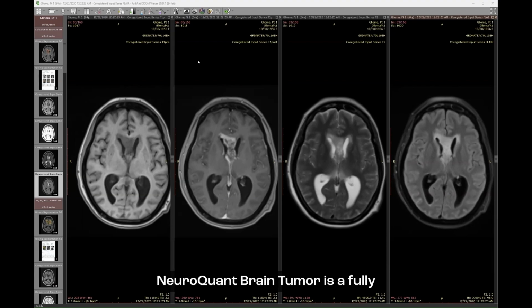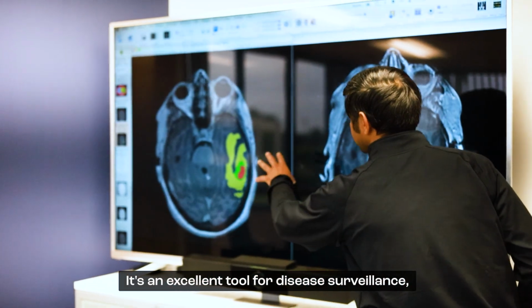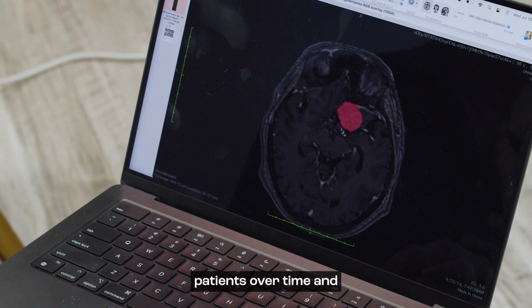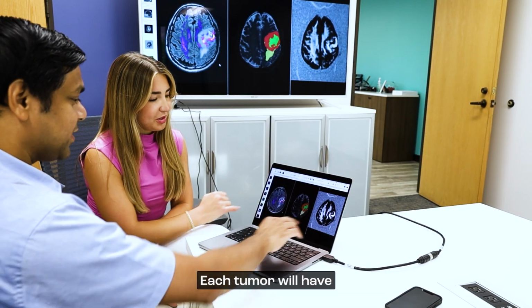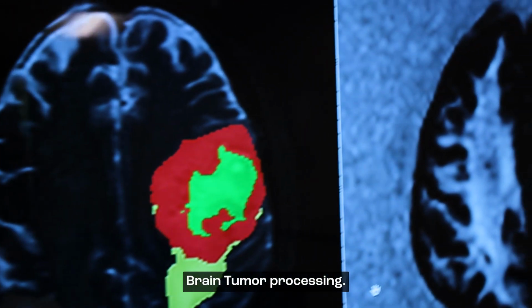NeuroQuant Brain Tumor is a fully automated, FDA-cleared brain tumor segmentation tool that provides volumetric information on high and low-grade gliomas, metastases, and meningiomas. It's an excellent tool for disease surveillance, offering longitudinal data to monitor patients over time and evaluate their treatment response.